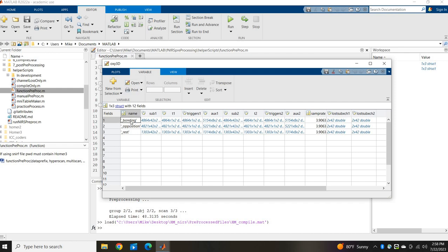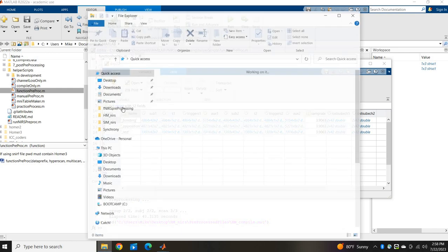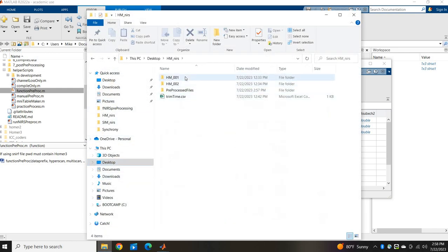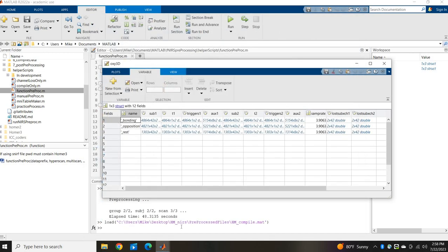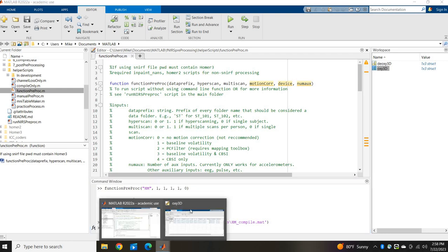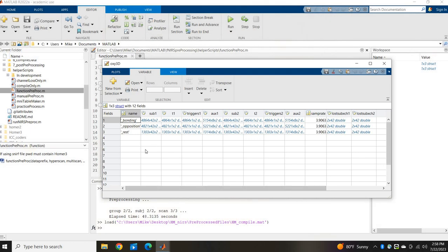I put in the ID actually incorrectly, the ID length incorrectly. That's why I'm getting this underscore. The ID length for this one I think was a bit shorter. Oops. What did I put? Let's just double check. I must have put 4. Doesn't matter. It's still fine. We still know what the scan names are. We just have that little underscore in there.